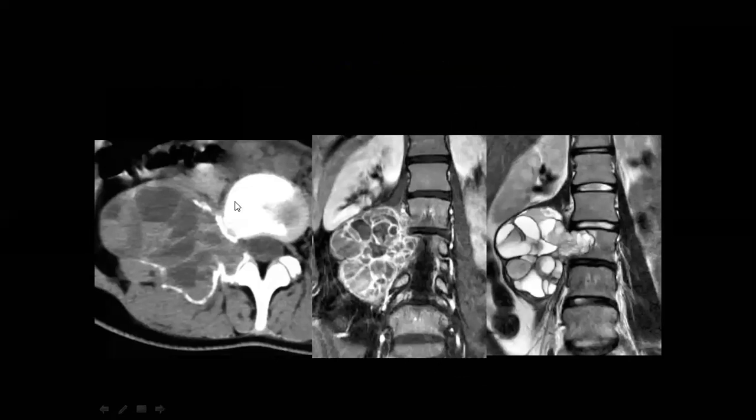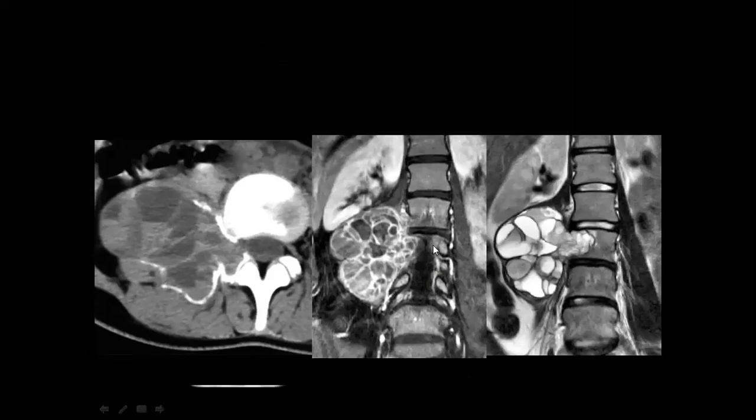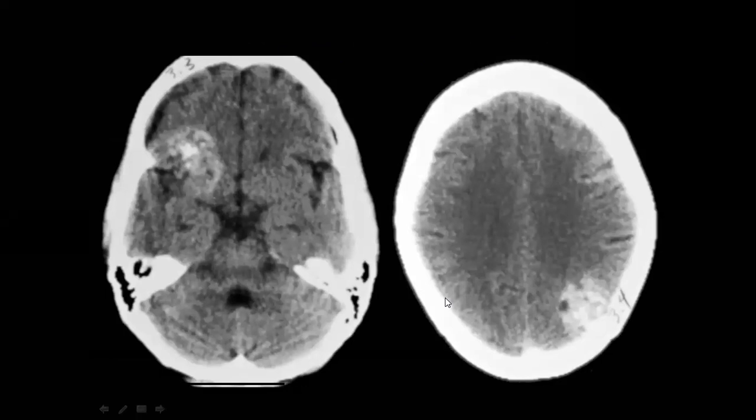Okay, and I think this is one of the bubbly appearances, and many people like it. ABC, or aneurysmal bone cyst, one of the lovely images. Most of us like it when you see it. But don't forget that it is not just that. You should put a differential diagnosis, and don't rush to aneurysmal bone cyst, because there is some differential it can look like, especially metastasis, osteosarcoma, and any sarcoma. So don't rush.